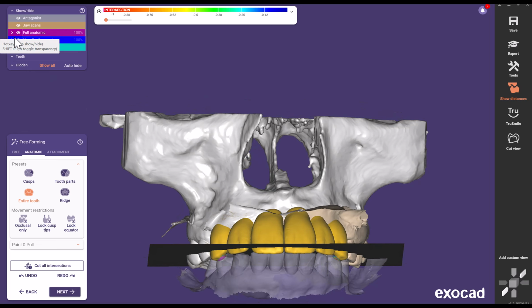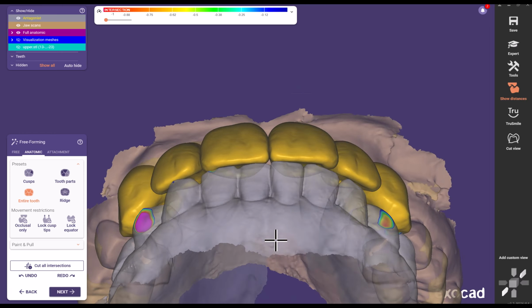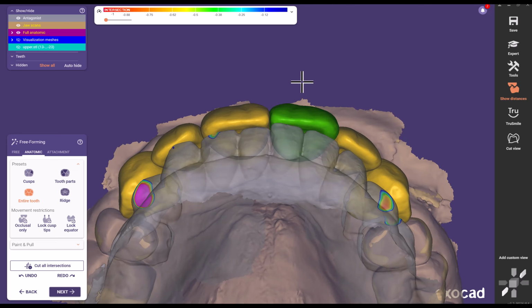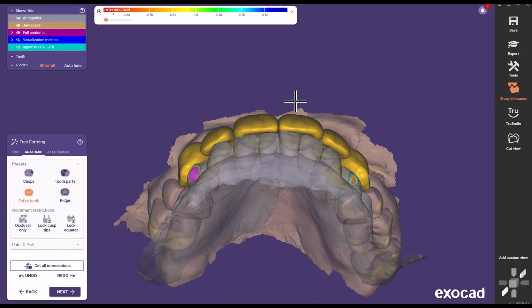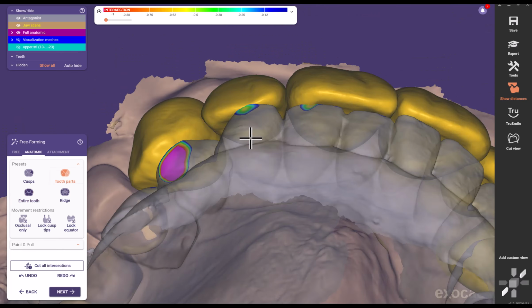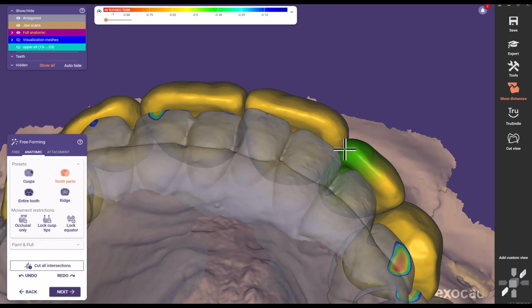All right, so with that done, all of that was really just to try my best to approximate the incisal edge length and the midline of 8 and 9. Once I've got 8 and 9, the rest of this, I'm just filling in the gaps pretty much. So I'll go ahead and maybe time lapse this because I'm going to just try to fine tune my tooth positions now.